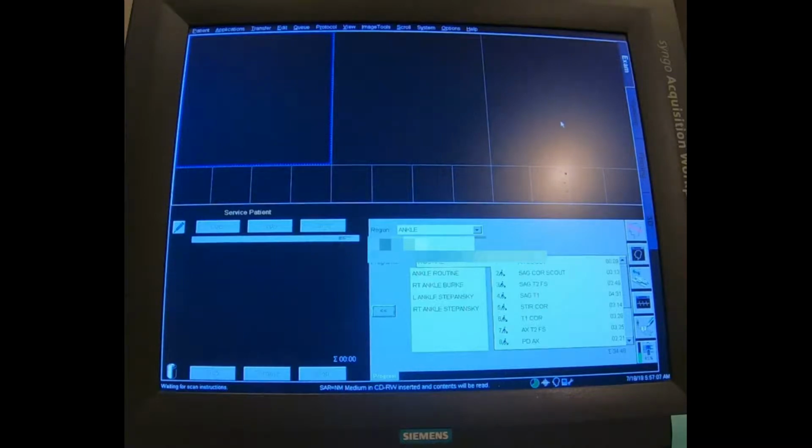Good morning. So today what I'd like to do is just go through some of the menus on your Siemens Syngo system. This happens to be VA25. It's older software. These will be the same in A series software, B, C, D, E. They're all the same. Beauty part about Syngo is that they didn't change much.